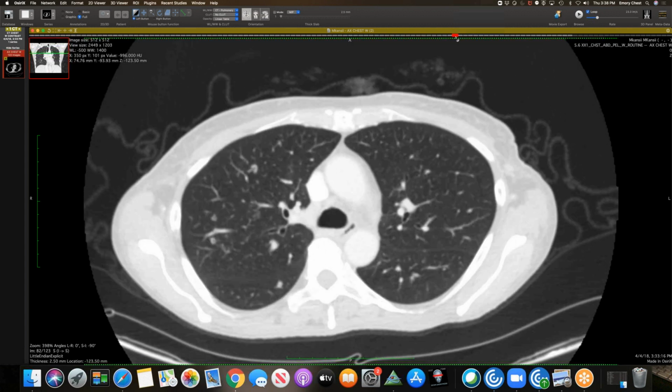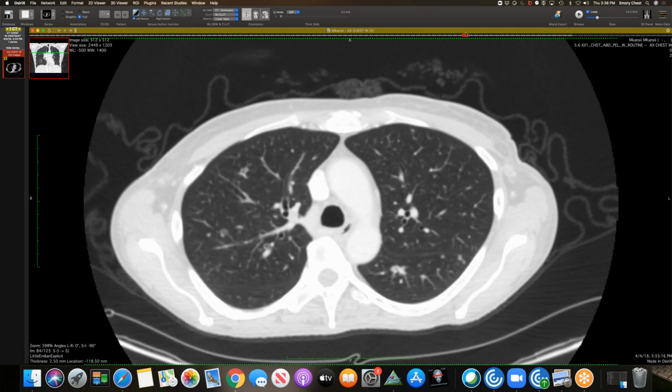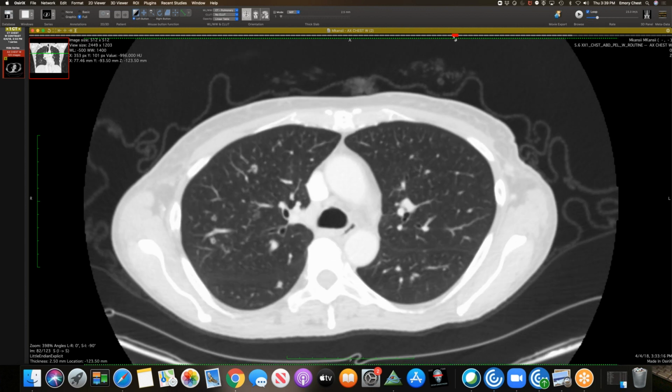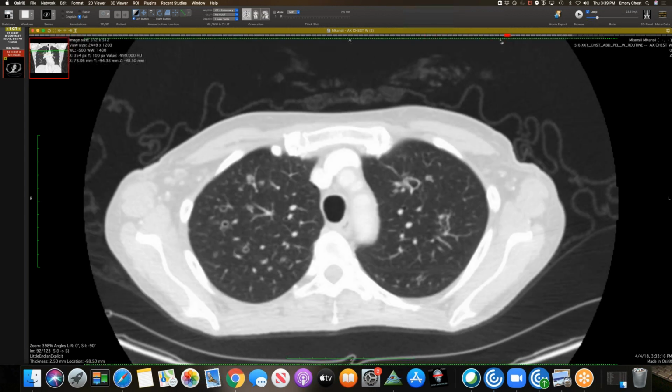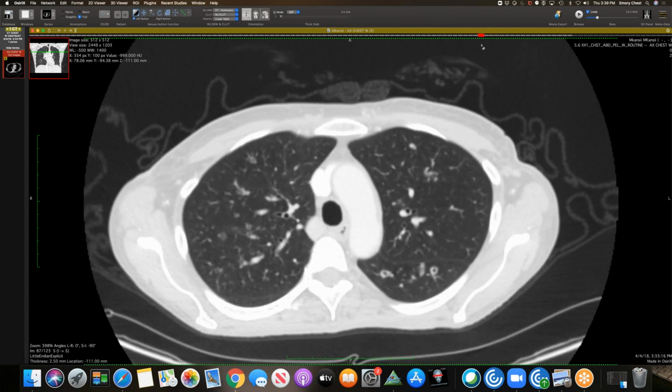I had never seen this before, but it's a cardiac support device made by a company called Acorn in Minneapolis. It was first developed around 2004. I'm not sure if it's still made actually. You can see this mesh sewn around the ventricles.